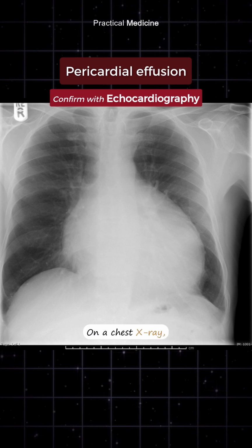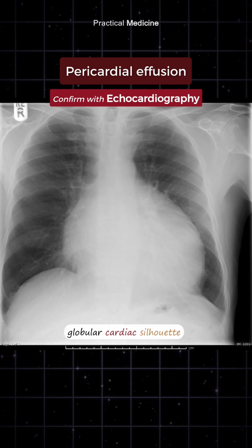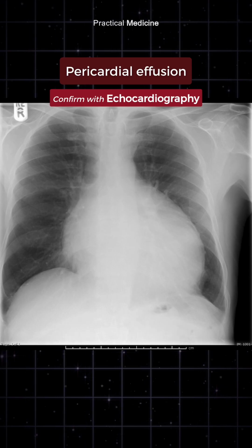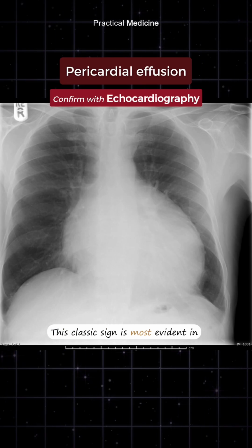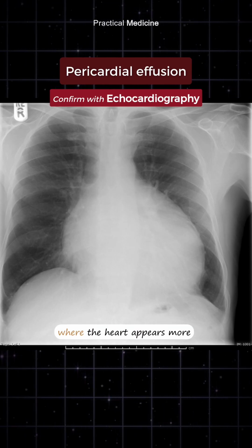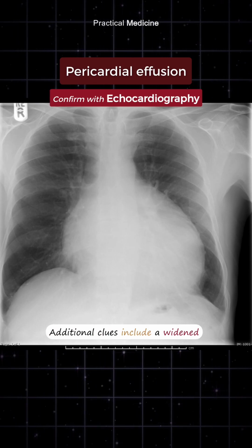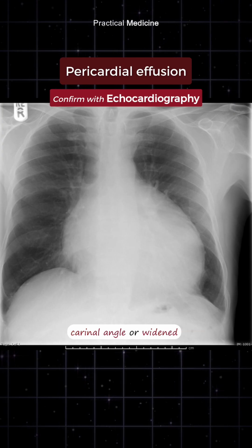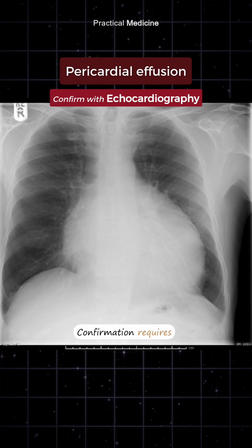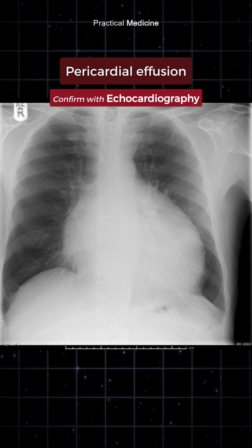On a chest X-ray, pericardial effusion often presents as an enlarged, globular cardiac silhouette resembling a water bottle shape due to fluid accumulation in the pericardial sac. This classic sign is most evident in large effusions and helps differentiate it from simple cardiomegaly, where the heart appears more irregularly enlarged. Additional clues include a widened carinal angle or widened mediastinum, though these are less specific. Confirmation requires echocardiography, as chest X-ray alone is suggestive but not diagnostic.